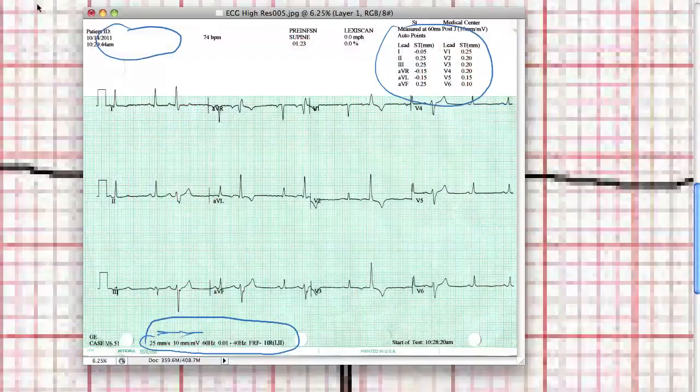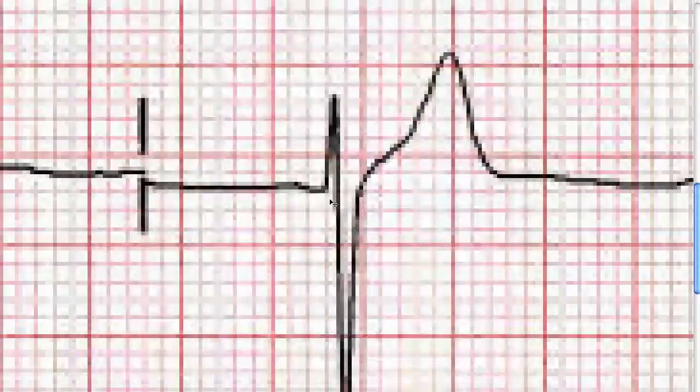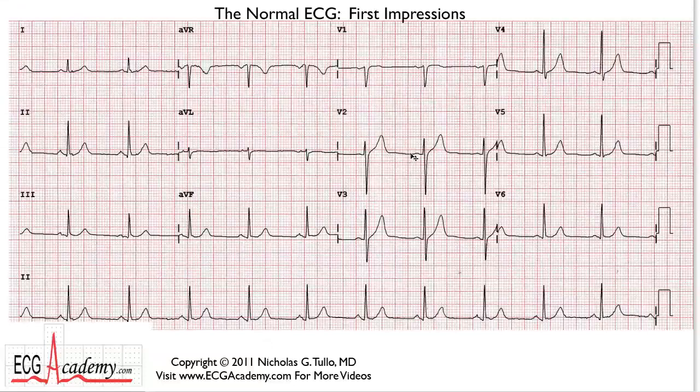So keep all that in mind as we go through these videos and I teach you how to become an ECG expert. Stay tuned for the next chapter when I talk about the size and duration of the calibration marks and how to actually begin to measure the intervals using a pair of calipers.